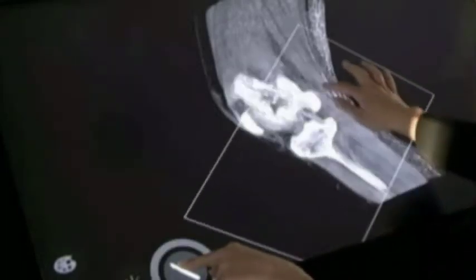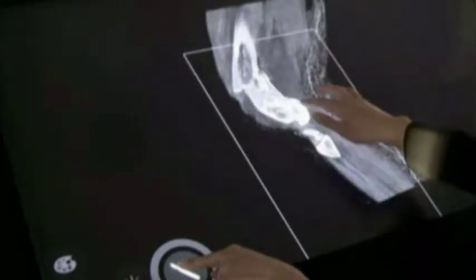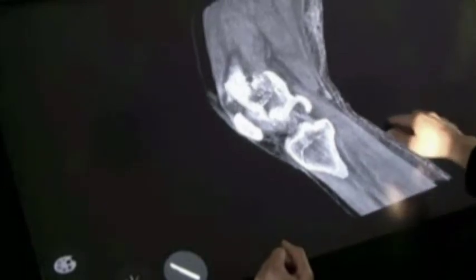And as you see here, now we have the quadriceps. I have also some visible vessels. And if I add something that is called a clip plane, I can cut into the volume. Like this. And now I also have the anterior and posterior cruciate ligaments visible. And I can zoom up just to make it a little bit clearer.